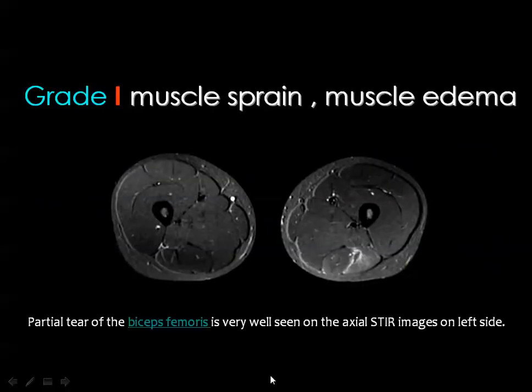And this is grade 1 or muscle sprain or muscle edema. You will not appreciate any signal changes in the T1, but you will see.